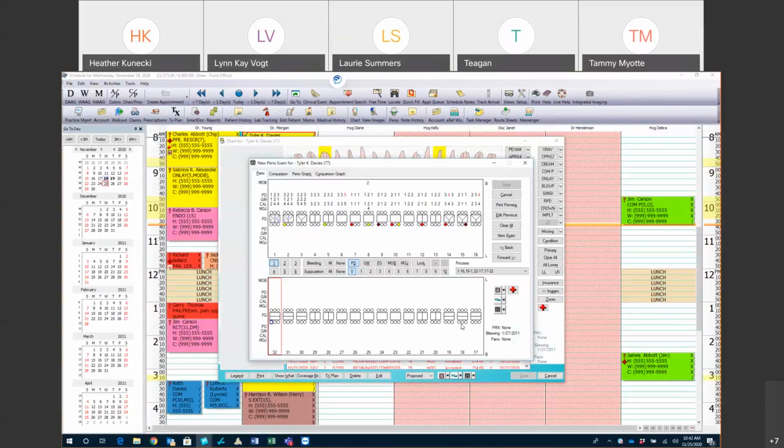So if you're on a pocket and you have a pocket over 10, do you see this little 10 button right here down here in the lower right hand side? It has a 10 with an underlined 0. If I were to click that 10 button, it does look like 0, but if it has an underline and it's red, red is the first indicator to know that that pocket is not an actual 0. The underline means that it's a 10 or higher.